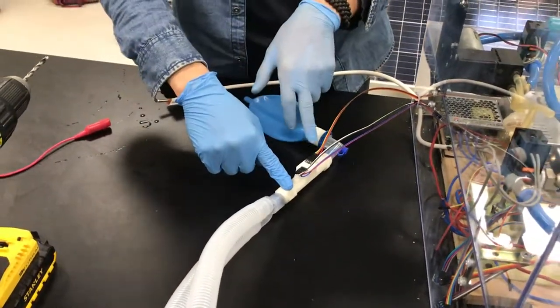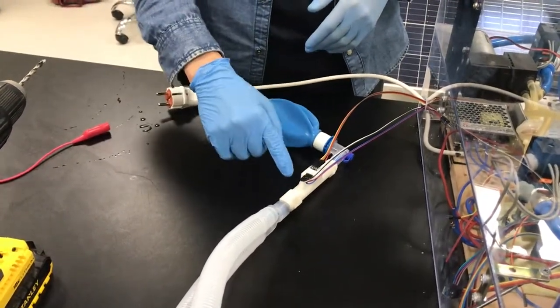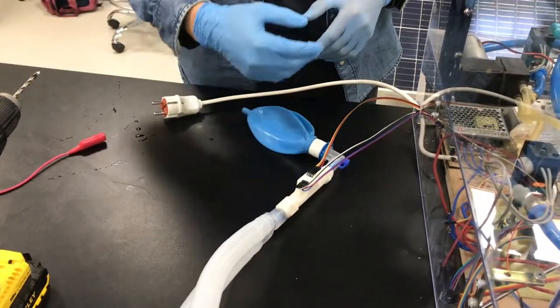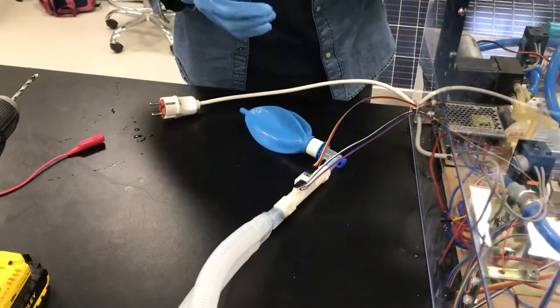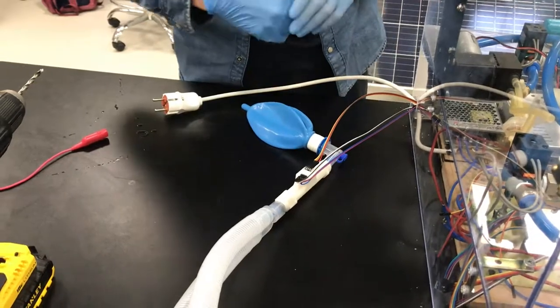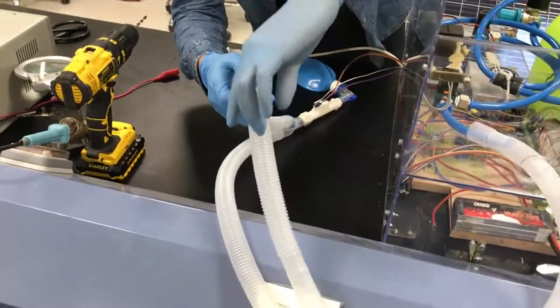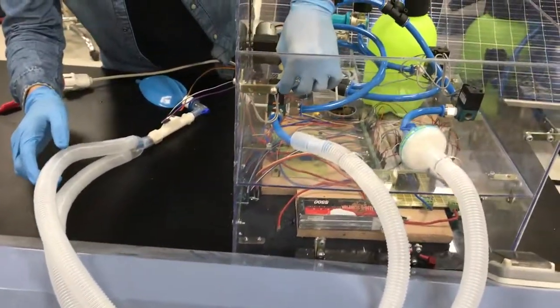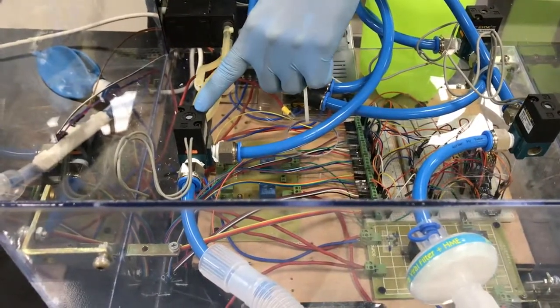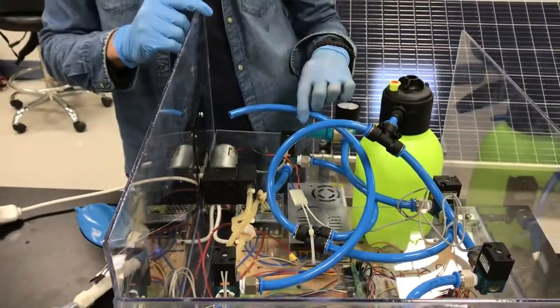The basic idea of this block here is to calculate exactly the amount of air going in and out and the pressure at the lungs at the moment you're calculating. Also, you have an oxygen sensor to see the amount of oxygen going to the lungs and out of it to see the saturation exactly. In the expiratory path, you have a solenoid here, which is also a high frequency solenoid valve controlling the expiratory pressure, which opens to the atmosphere or the ambient.